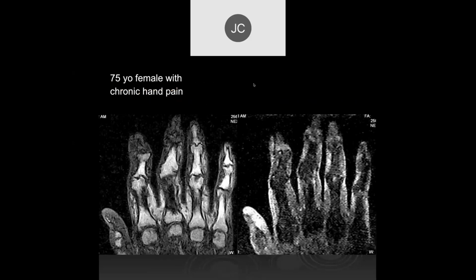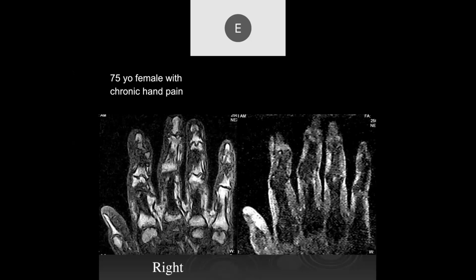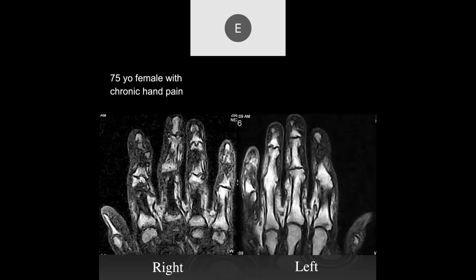Elior. All right, we see deformity of that second digit, destruction of that DIP joint, second and third. Of course, worried about inflammatory arthropathy like psoriatic arthritis. Yeah, present on both sides. It looks like, yeah, fusion of those PIP joints on the left.